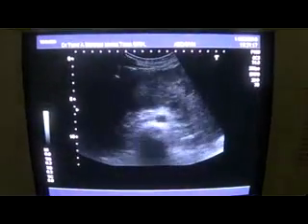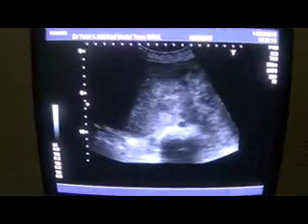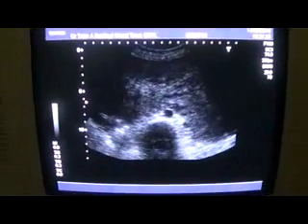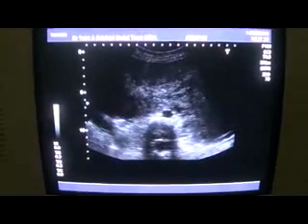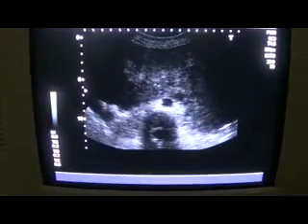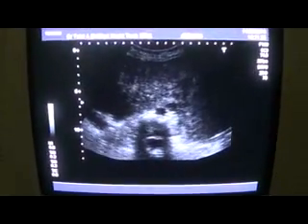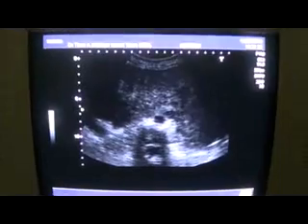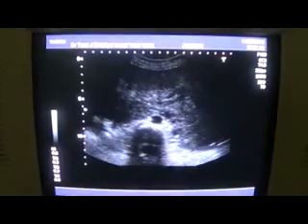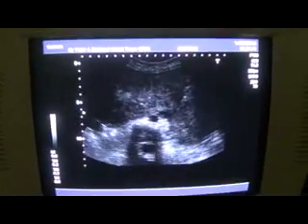Now, what can it be? Had I not seen the ovaries, I would have considered it a mass of some aggressive nature. But as both ovaries are intact, I will rule out any aggressive pathology. Secondly, had she been pregnant, we would have checked whether the beta hCG level was raised.